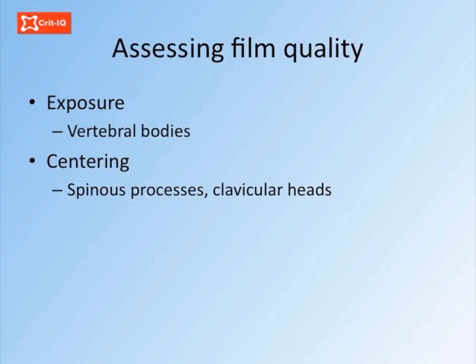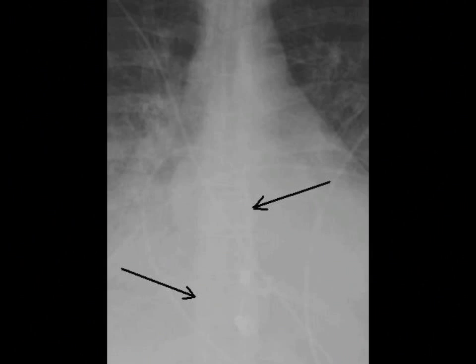Film exposures are standardised to ensure consistency of imaging. By convention, a correctly exposed chest X-ray will enable you to just visualise the vertebral bodies through the cardiac structures, as seen here. Over-penetration will make the lungs look darker than they should be, and vice versa.